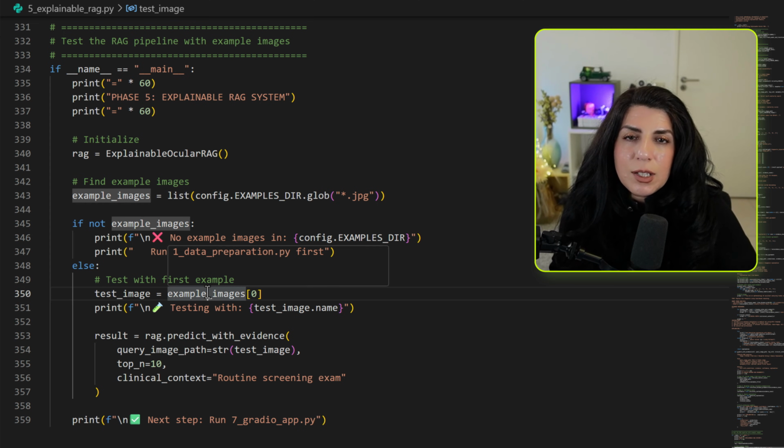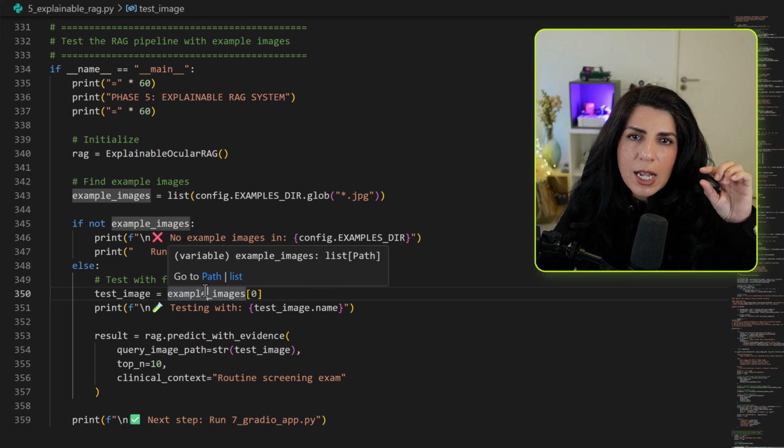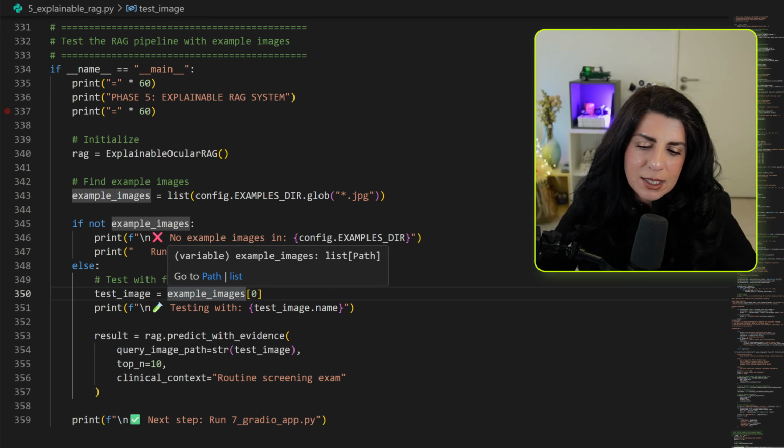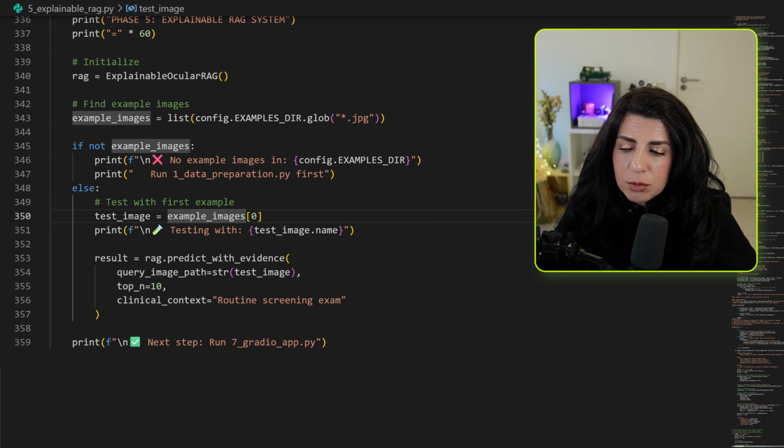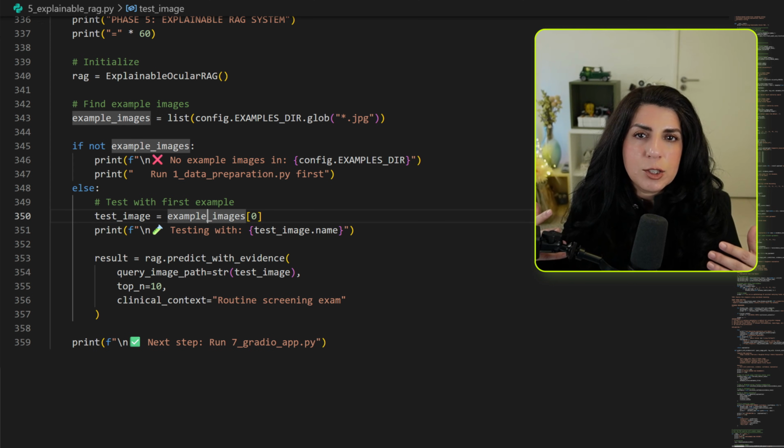So now we can use this explainability to build our user interface. And what we could also do is add those pictures and images that have been selected. In this way, they can also visually see what has been selected. But just before we get to building our Gradio, is explainability alone enough for doctors to say this is a trustable system? Not really, because they also need an overall evaluation of your system: how good or bad do you think that general prediction is?